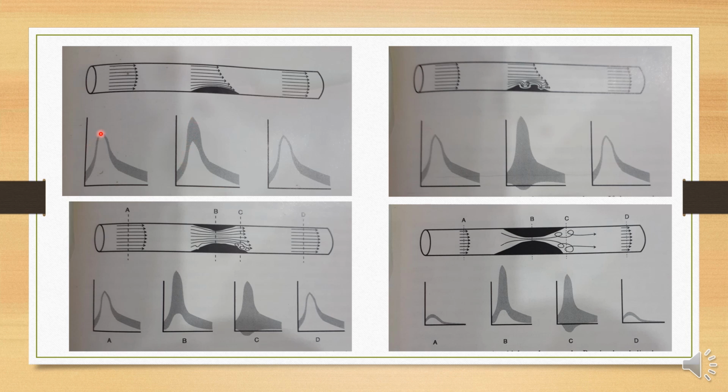So this is a normal waveform, a smooth, sharp peak of the peak systole. But when there is a turbulent flow, the spectral peak will show widening. This is called spectral widening. So this is also spectral widening, and this is a complete spectral widening. This denotes stenosis if the vessel is straight. So spectral broadening or spectral widening is another important point which denotes stenosis.